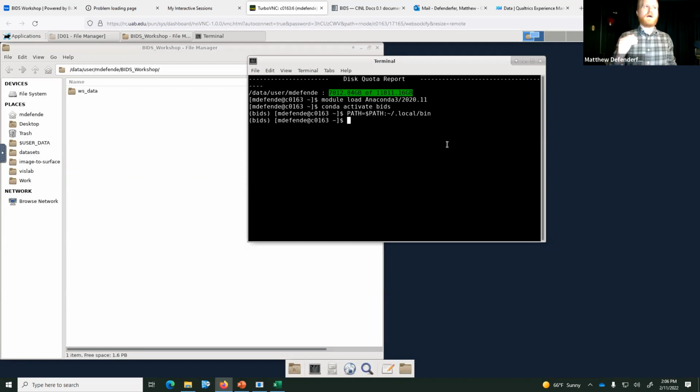There's really three major steps when you're just starting off, okay? So the first step that we want to do is generate a generic heuristic file, as well as generate a table file with all of the information about all of our scans in it, so that we can use it for matching in the next step, okay?